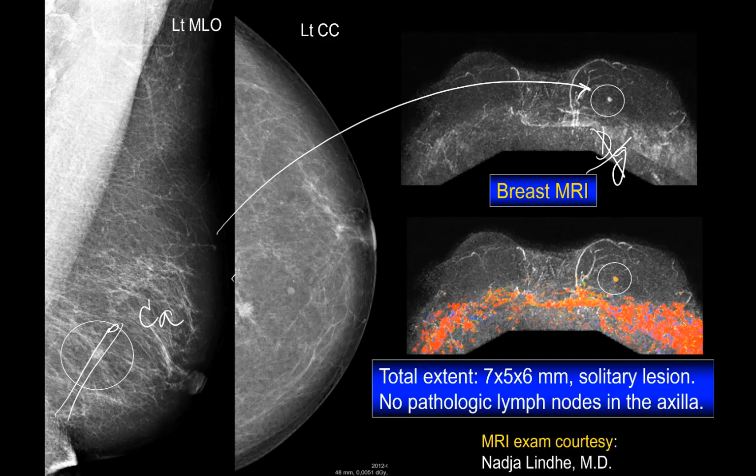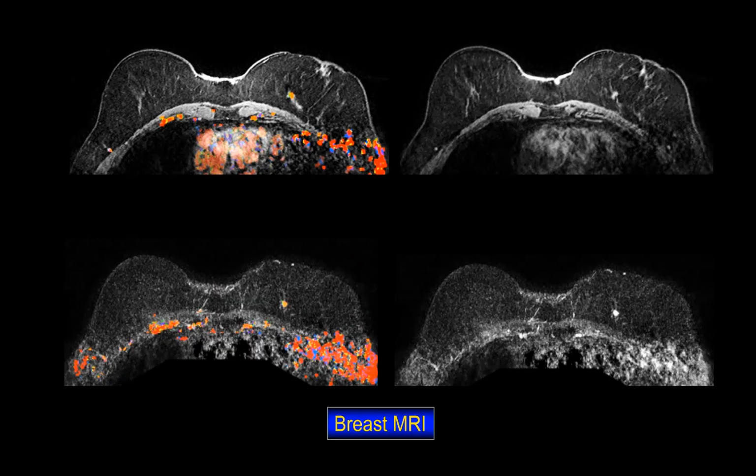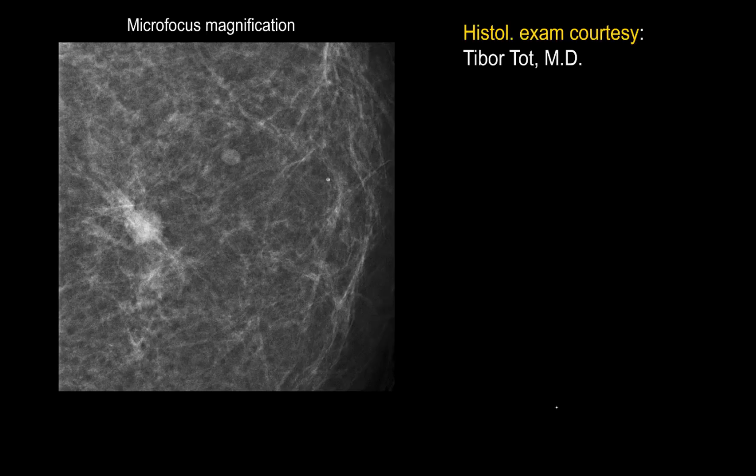I'm going to ask the surgeon to take this one out as well, which turns out to be intramammary lymph node. The MR is here to determine the extent. And if the surgeon only takes out this little, that's a mistake. Let's look at it. It still shows that it's easy, unifocal. There are no satellites, no in situ component, nothing. And that's what you believe.